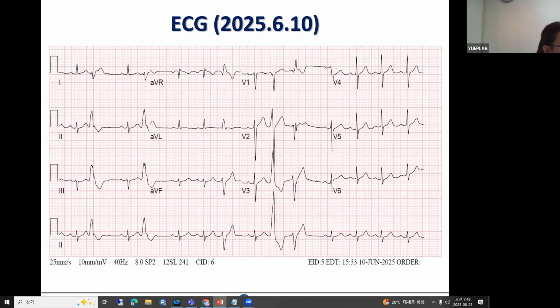So that raises the possibility of what? If you had one focus in the septum, one possibility is that it exits both sides. That's one possibility. The other one is because V1 still has a Q wave even in the right bundle pattern. Let's see here.